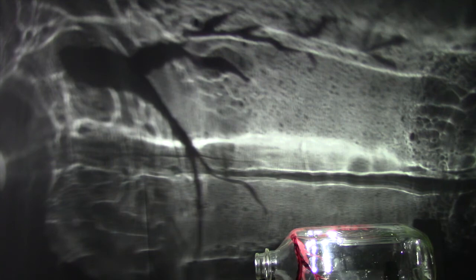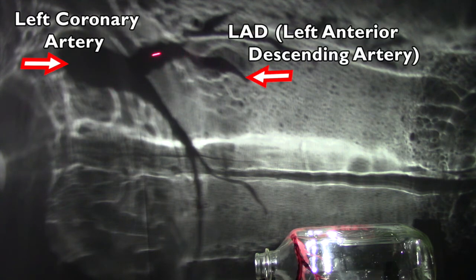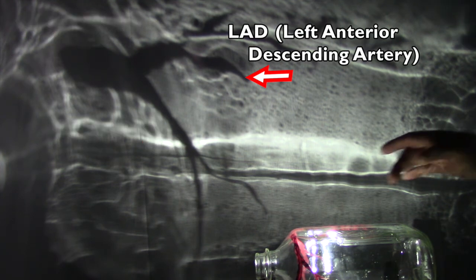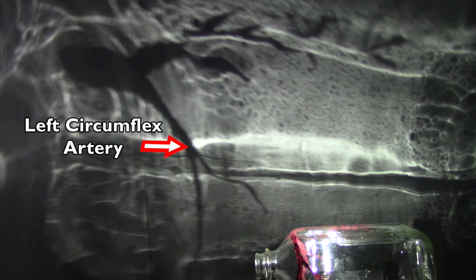Now the X-ray beam is projecting through the heart at a right anterior oblique angle with cranial angulation. From this view, we now see both the LAD, shown here, and the left circumflex artery, shown here. Notice how the LAD is at the top of the image. This is because the left anterior descending artery runs along the anterior aspect of the heart, as shown here. The left circumflex artery is wrapping around the side of the heart, and so it's seen lower in the image because it's supplying the lateral wall of the left ventricle.